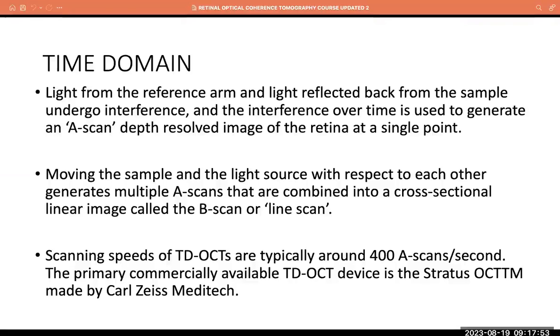So if you see that on the OCT, it is a differential. You have to put the accurate differential that's presented in that way as your diagnosis. It could be diabetic macular edema, it could be central retinal vein occlusion, it could be uveitis, it could be ROP with macular edema. So the OCT does not teach you the science. You only use the OCT to verify what you already have an inkling as to what your diagnosis and differentials could be.